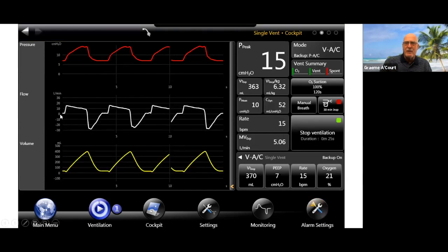Okay, so again, you can sort of see what I've played with over here is I've just made little changes to see what I could do. That was there before, I moved it up to there. Everything can be moved around. What's quite good on the Bellavista, you can actually freeze the screen. You've got some cursors to move across this and do screenshots.